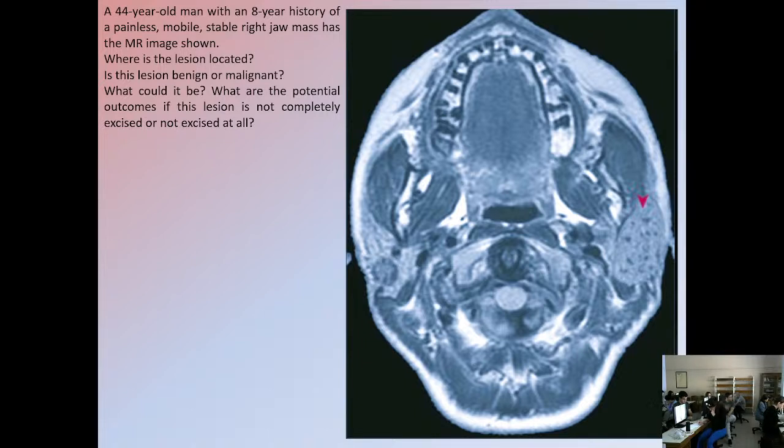They have some acini and some glands which are called ducts in this case. Why? Because they have double cell lining. The luminal cells looking at the lumen and the myoepithelial cells which are necessary to contract so that saliva reaches the mouth. This is the ductular structure. Two types of cells.